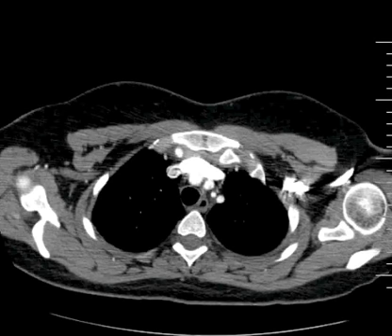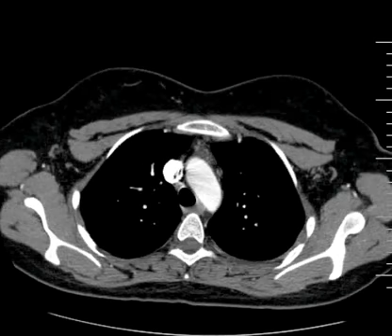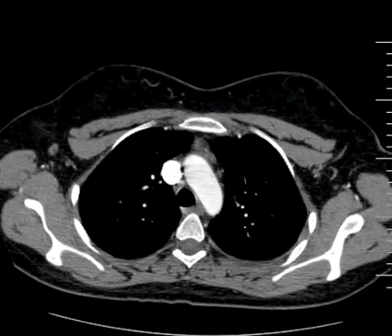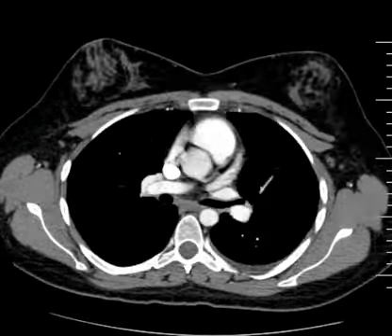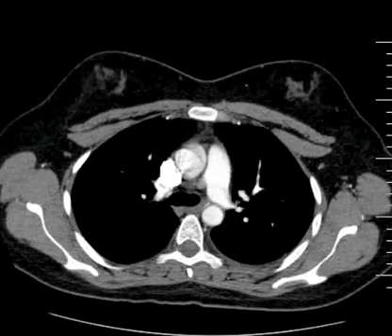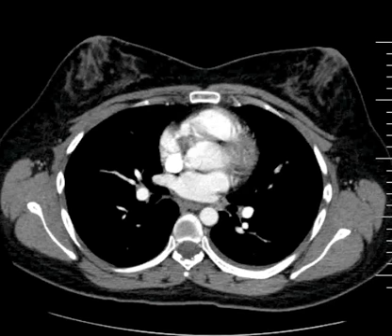So when the two brachiocephalic veins join, you get a little bit of a sense of the intermixing of opacified and unopacified blood there. And even at this level here, you see little swirls that are the unopacified blood, but you know you're in the superior vena cava here, and the arch of the aorta. Continuing downward, we know we're in the main pulmonary artery, right and left main pulmonary artery. Now we're not going to see anything in this case in the main pulmonary arteries. So take a look as I course up and down. This is just what I would do, reviewing the case, and look and see if you see any filling defects.